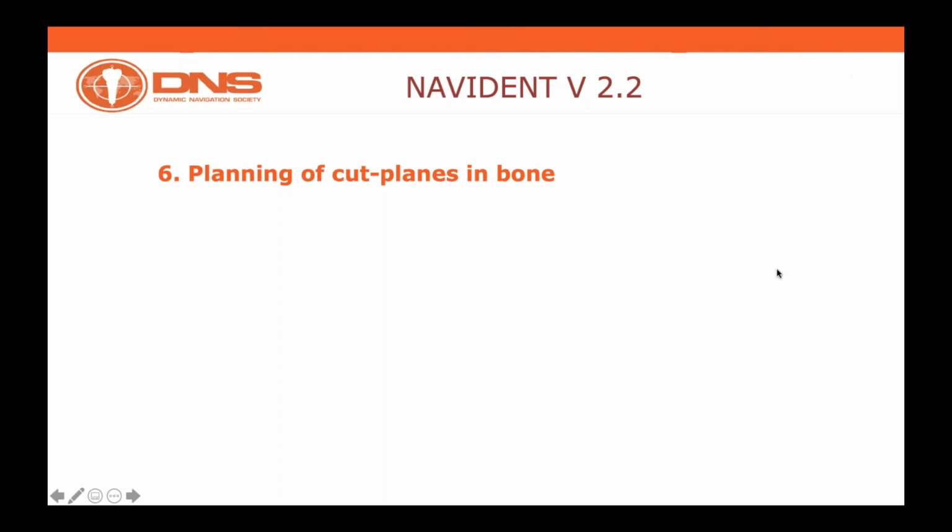The proposition is to import the plan of the smile, and to get that information compounded into Navident. So that's equally another application.